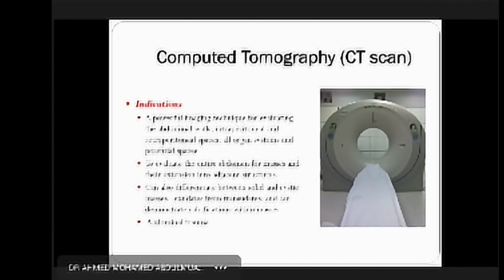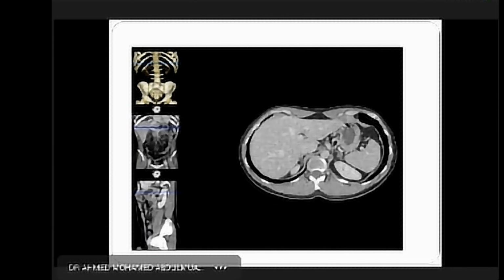So you can see the laceration and what segment of the liver, what lobe of the liver it involves, and we can make out whether it is involving any blood vessels and whether there is oozing or hemorrhage. So we can see easily and we can stage it.